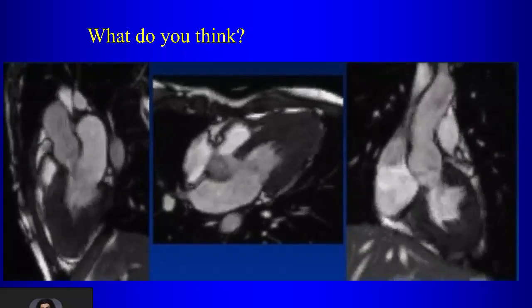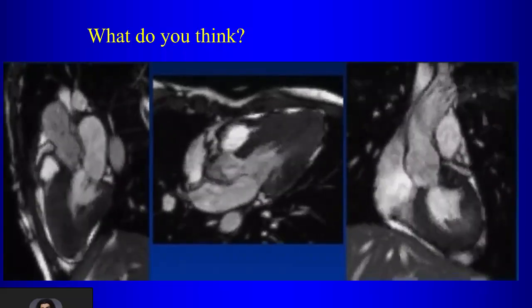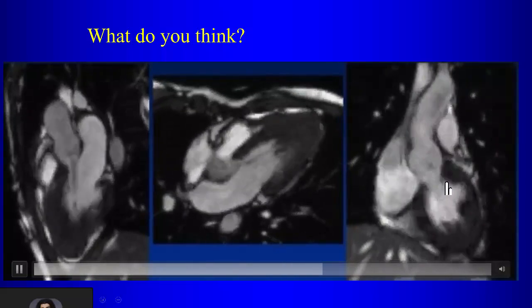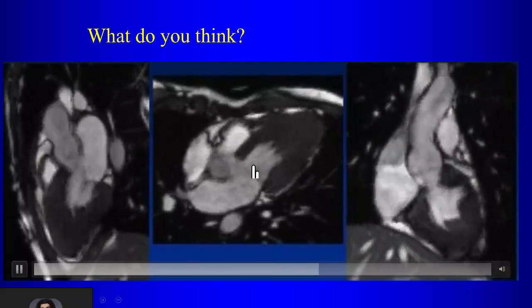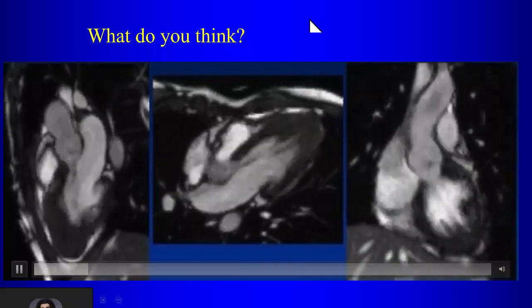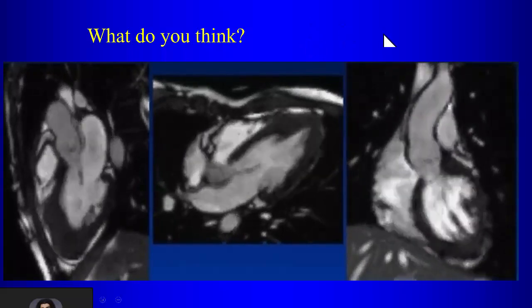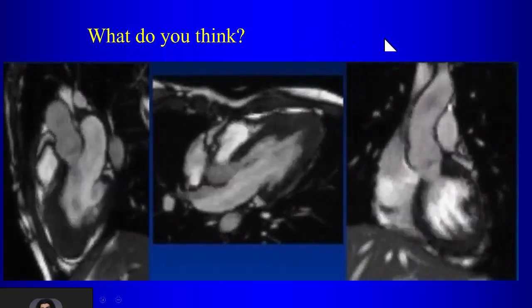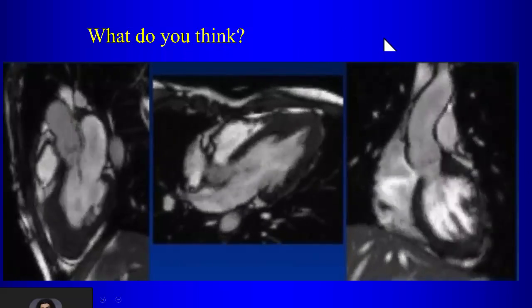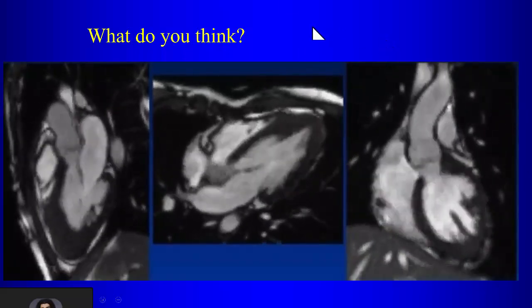Yeah, so a rare cause of subaortic stenosis is a subvalvular membrane. And you can barely see it, right? There's this thin little dark area that's going across here. You can barely make that out. So subvalvular membrane is an unusual cause of stenosis, and that occurs right below the aortic valve in the same location as you would have hypertrophic obstructive cardiomyopathy. But of course, we don't see hypertrophy of the outflow tract here.